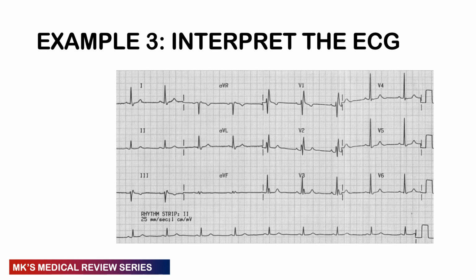Then afterwards, we shall look at many different examples where you can actually test yourself, and then we'll also look at the different abnormal rhythms that are there in terms of the ECG and cover these different rhythms so that you can be able to pick up these pathologies on the ECG. So here comes the answer.